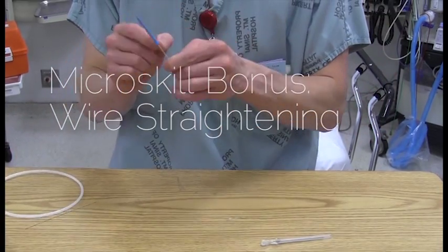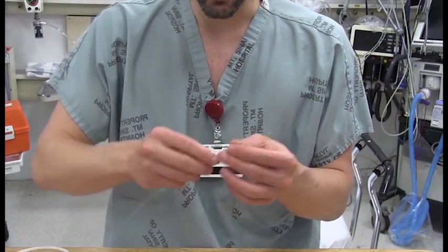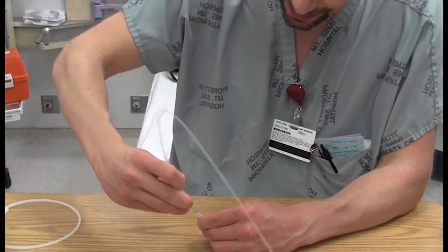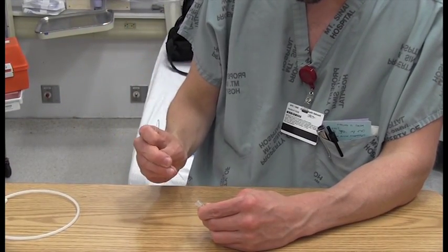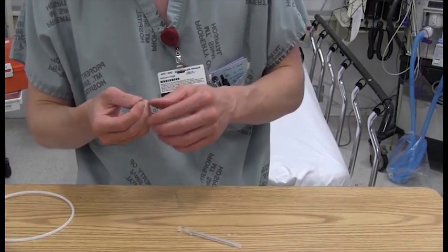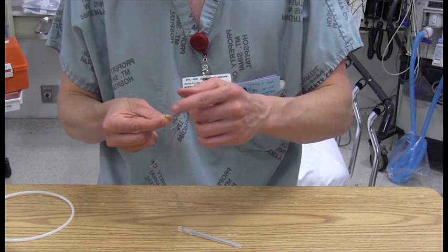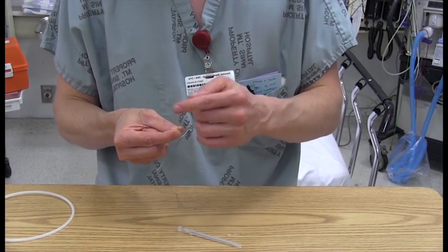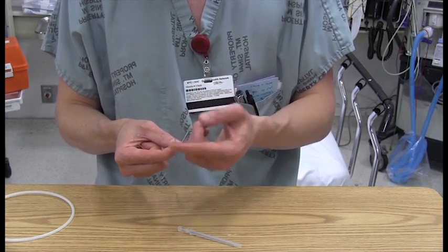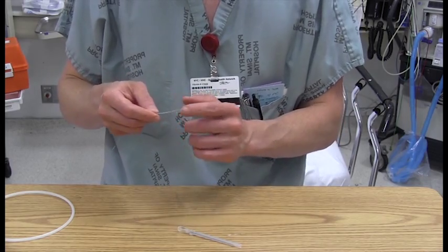For instance, if you lose this thing, well, now you're stuck with a J-tip. And you could do the ridiculous manipulations where you try to turn it upside down and force it in there, and it's annoying. And that's not the way it's done. And I should say, you can use the back portion of the wire. It's not as safe, but it's still not designed to protrude through the vessel. This is acceptable, and sometimes you have to do that. But the J-tip is safer because it's actually a rounded edge hitting the vessel wall.